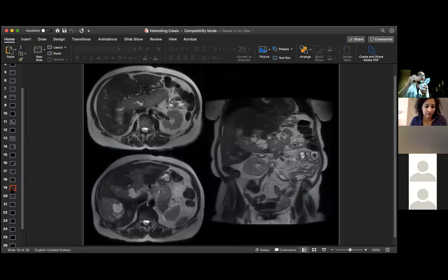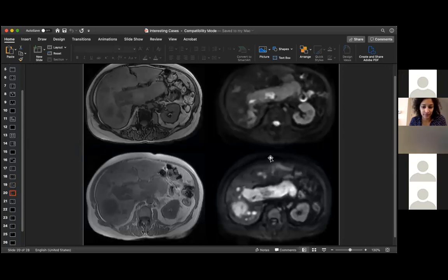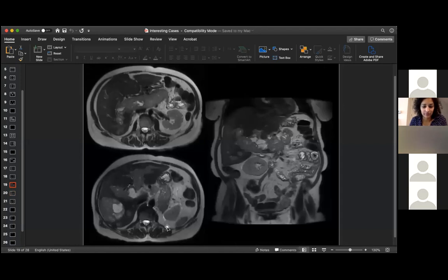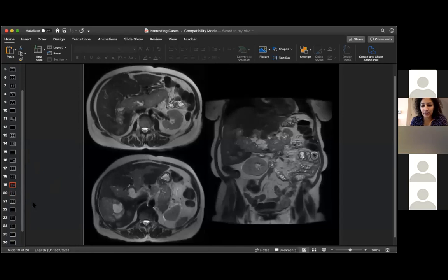So any observations here? What structure do we think this whole process is arising from? So T2, axial. I'm thinking portal vein and splenic vein, like Gaurav said. Amar has also typed in epithelioid hemangioendothelioma. Okay. What organ is this following, roughly? Pancreas. Right. Okay. So again, evil gray, as you said, in and out of phase, not very helpful. You can see that the solid components of this are highly restricting. You can see that there are probably some cystic components internally right here. Neuroendocrine could do this too if it was replacing the pancreas, and then it can also invade the veins.